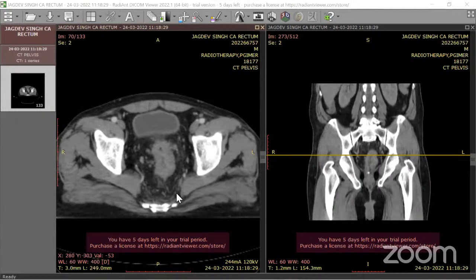So it varies so much, and you can see that daily variation is there definitely. So I wouldn't edit an elective volume which is going into the bladder. Maybe at least for other structures like a muscle or a bone, I would definitely do it. But not in the bladder.